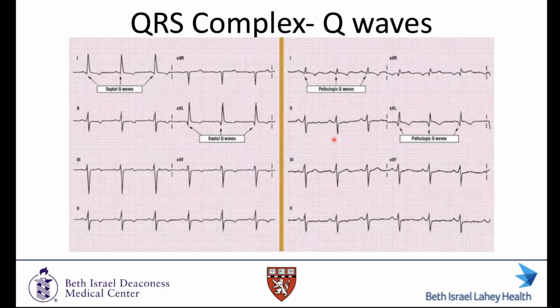And you know, this is a bit off topic. Typically, Q waves indicate infarction. There are other rare cases, such as in patients with really thick myocardium, hypertrophic cardiomyopathy, when there's unopposed anteroseptal thickness, you can often get reciprocal inferior Q waves, but that's a bit more of a niche situation. Also good to know.